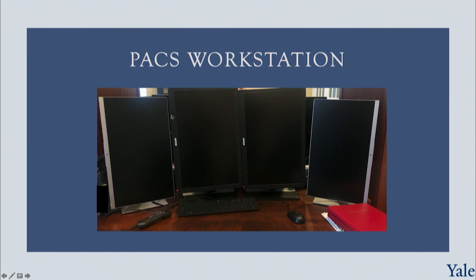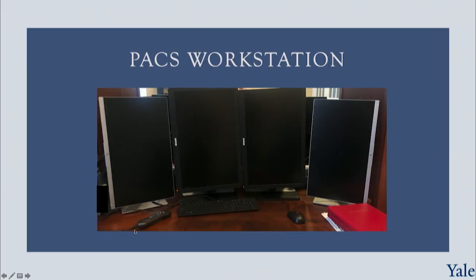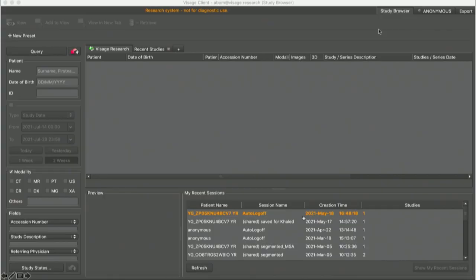Here's another 2 monitors on the sides. These can be any monitor that you can purchase, and this is where my electronic medical record and my dictation software are displayed. Here's a dictaphone that I use for dictating the reports, and we have the keyboard and the mouse to get around. So how does PACS look when we pull it up?